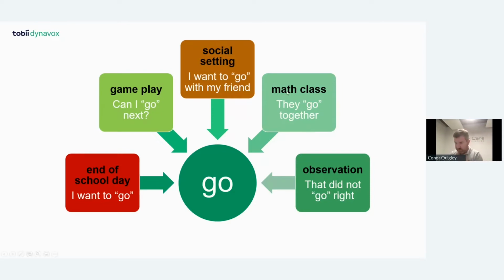So that's why we focus a lot on the core words within this page set. We have lots and lots more resources on core words and core first learning, and lots of programs. I'll show you them towards the end, and where you can find more information on the core language and how we use it.